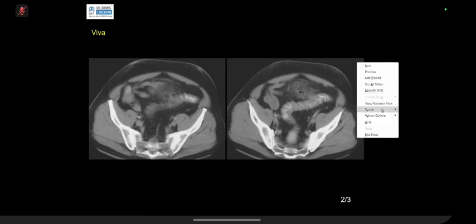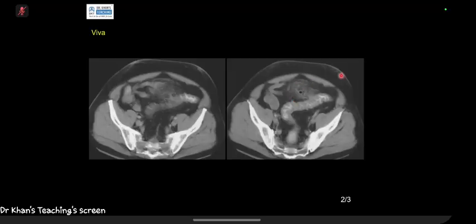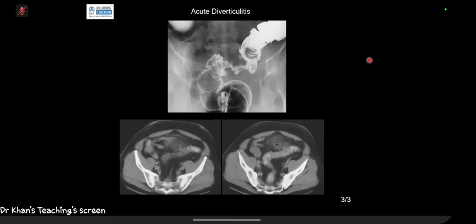Now, a surgeon can ask us, or on the other hand, we can be over exuberant and tell the surgeon, oh, please do a laparotomy, that kind of a thing. No, no, it doesn't work like this. These gas bubbles don't count as pneumoperitoneum. Conservative management is there. Otherwise, if you see air all the way up below the diaphragm, then you call it. It means the perforation is real big. And if you see ascites, etc., then you say that this is a problem. Because I'll tell you the surgical staging.